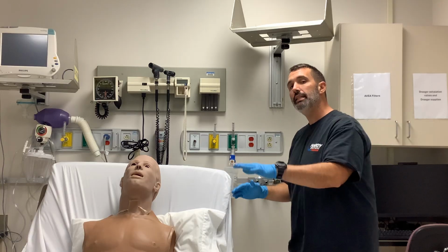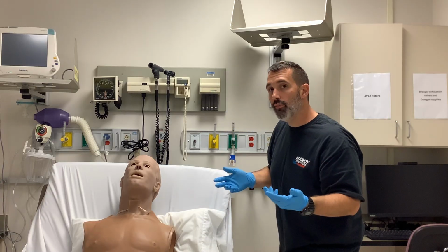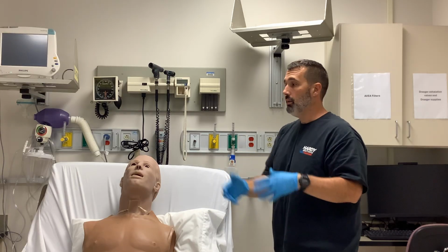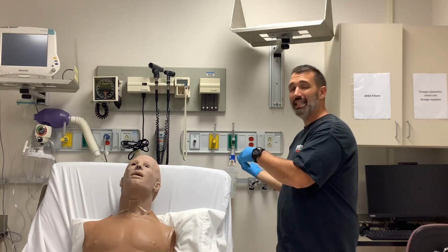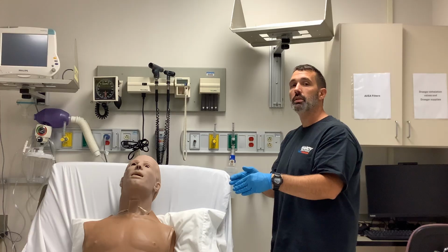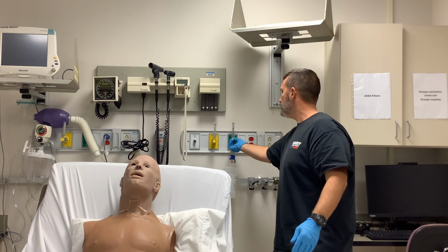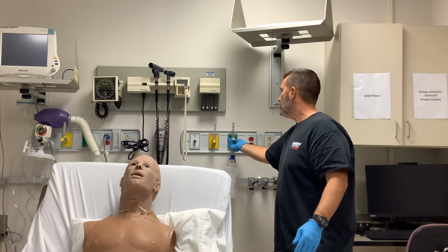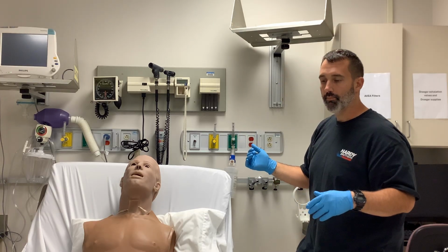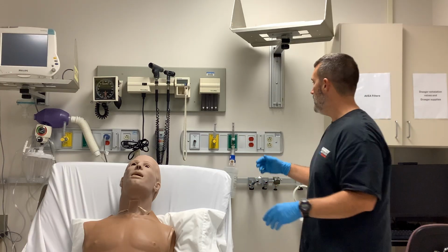So going off of FDO2 versus FiO2, if this patient's peak inspiratory flow demand is, say, 40 or 50 liters per minute, and I'm now only providing 10 liters per minute of 60%, when they breathe in, that's going to be 21% that mixes with that 60%, and it's going to be even less. So yes, I'm delivering 60% to the patient, but are they breathing 60% in? Probably not. How do you fix it? Crank your flow up. Crank it up as wide as it'll go, and then that will entrain the most amount of air, so that it increases the total output flow to your patient.